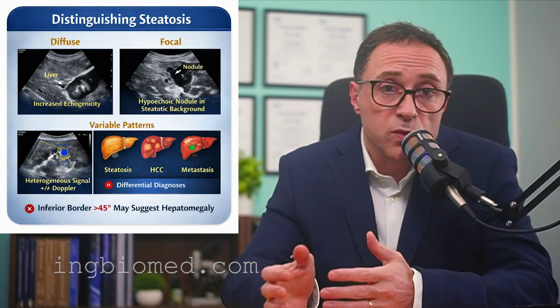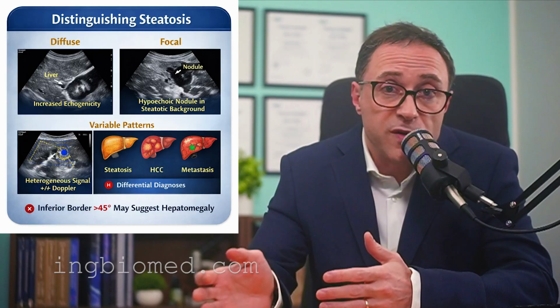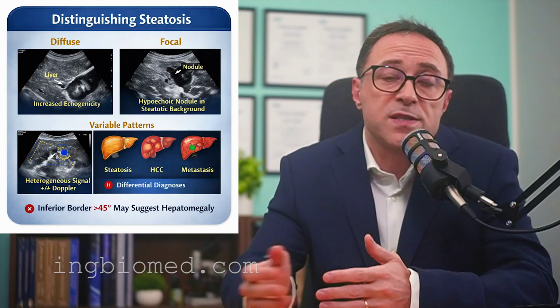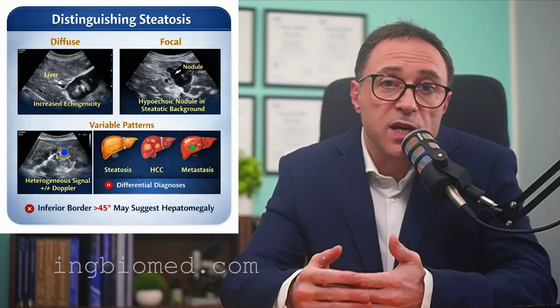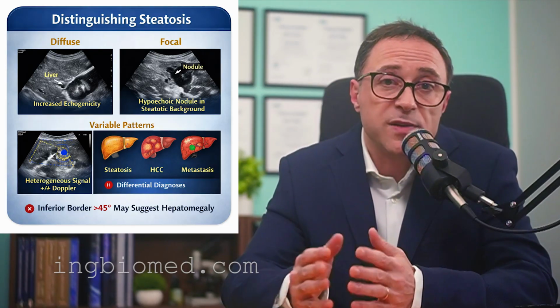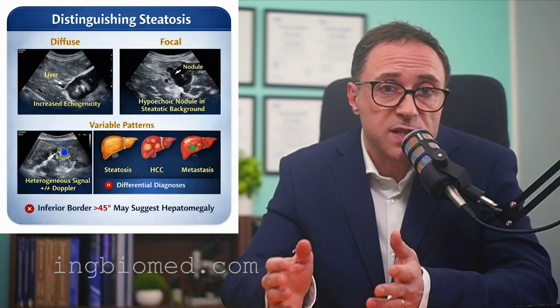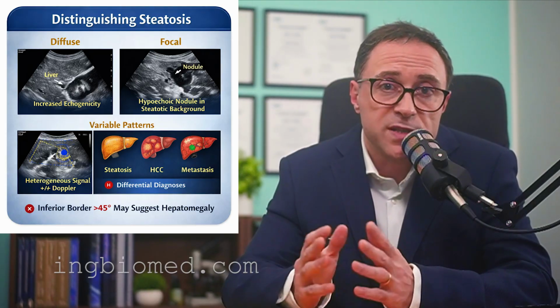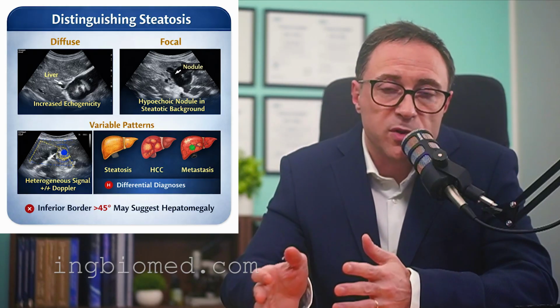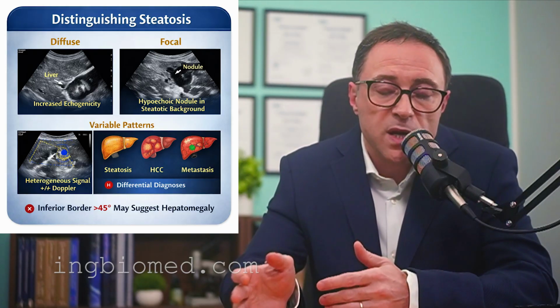Moving to parenchymal diseases, steatosis is one of the most frequent findings. Diffuse hepatic steatosis results in increased echogenicity compared to the renal cortex. In advanced stages, ultrasound attenuation limits visualization of deeper structures and posterior beam penetration is reduced.